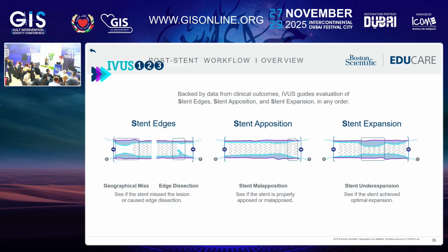It is very important that when you observe your stent at the outlet and the inlet, the immediate thing we look for is dissection. We are trained that way. But it's also important that you do not have any geographical miss. Our understanding of geographical miss is always an area between the two stents. But a geographical miss can also be missing the plaque, so you are landing the stent in an area where there is a plaque burden of more than 50%.